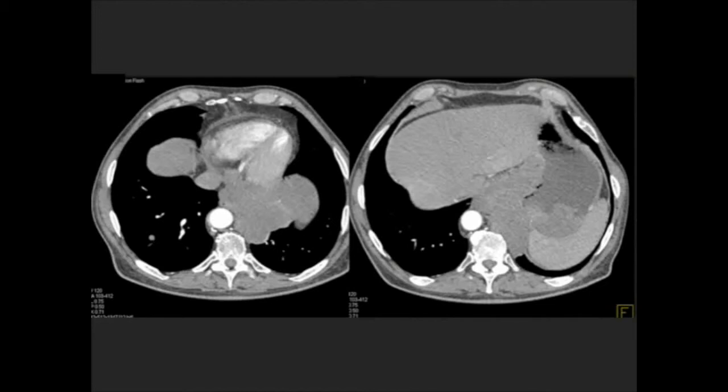So lymphoma is in the differential. Adenocarcinoma of the GE junction alone is kind of bulky for that, but I guess I couldn't say no. It's not extramedullary hematopoiesis, that would show enhancement, and surely doesn't have the appearance. This was an unusual case.